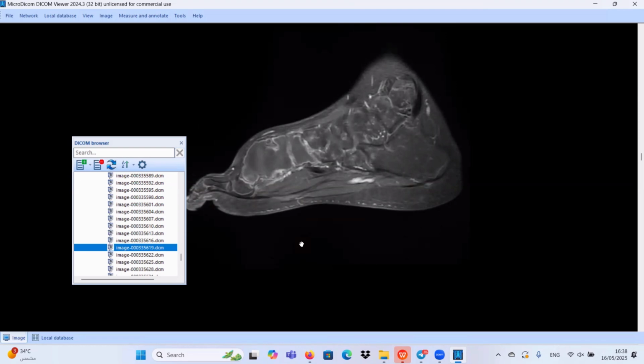So we have a large, markedly expansile or bubbly lytic lesion with some internal septations, as we saw in the X-ray. If we think about the expansile lytic lesions, is it fibrous dysplasia?